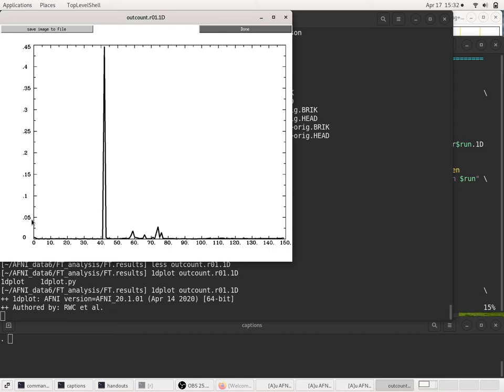0.05 is our censor limit. So if I draw a horizontal line here, anything that hits that is going to be censored, and that seems to only happen right at this spike. The rest of it is very flat. That's one reason I like these outlier curves, is they're not so noisy. It's fairly clear when something is happening and when something is not happening.